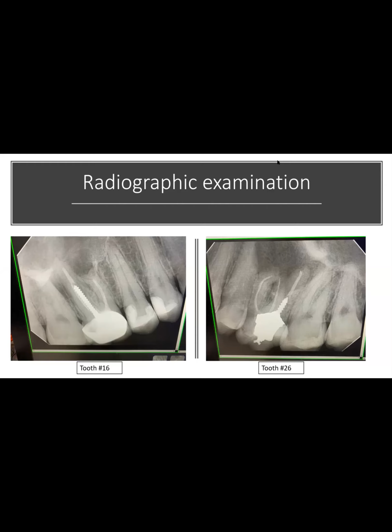The 2.6, let me take a look. There's a large radiolucency around, I think there are 4 roots there, but there's a large radiolucency right there. And I see a really large palatal root that isn't treated, and there's a big radiolucency around it. But I can't tell the borders.